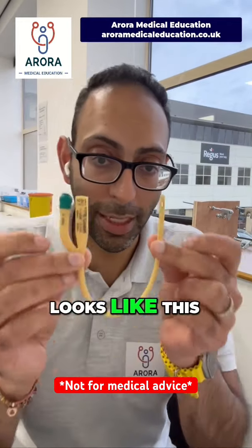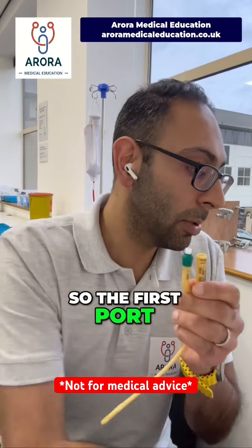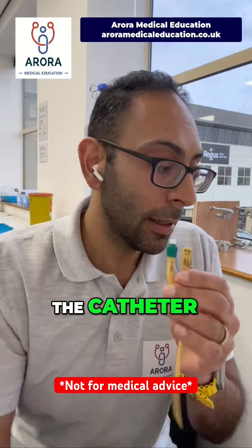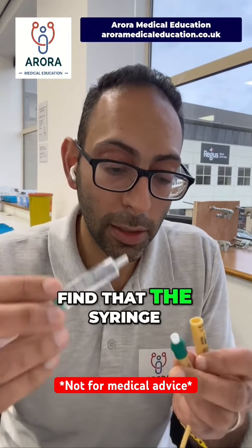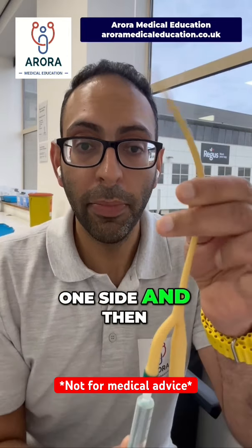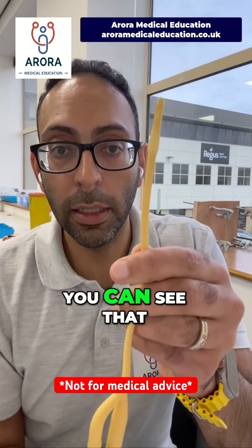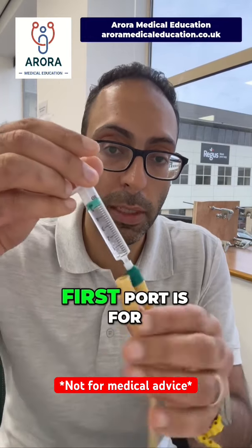So generally a catheter looks like this. You've got two ports on the end. Okay, so the first port, so when you insert the catheter, the first port is to use to inflate the balloon, and you'll find that the syringe will only fit in one part of that one side. And then when you put the fluid through, you can see that balloon expands. So that keeps the catheter in place. So that's what the first port is for.